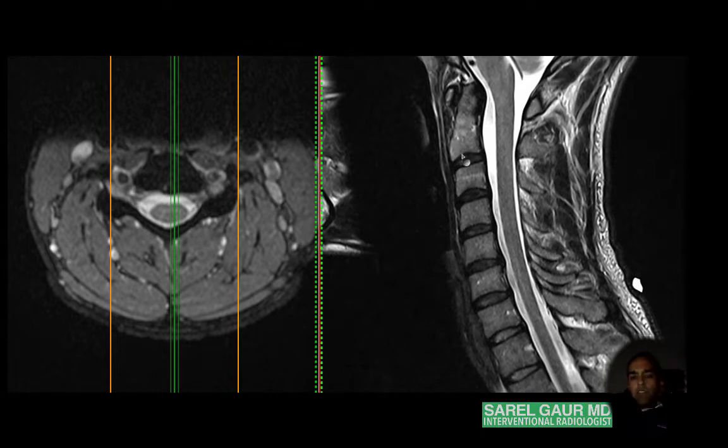make important findings. So to me, when I'm looking at the cervical spine, I look mostly on the sagittal to start. Always start with the sagittal. And I think about cord and column. I think about column and cord. So cord, column. Those are the two main components you really want to look at. You really don't want to look at much else, especially when you're starting out.